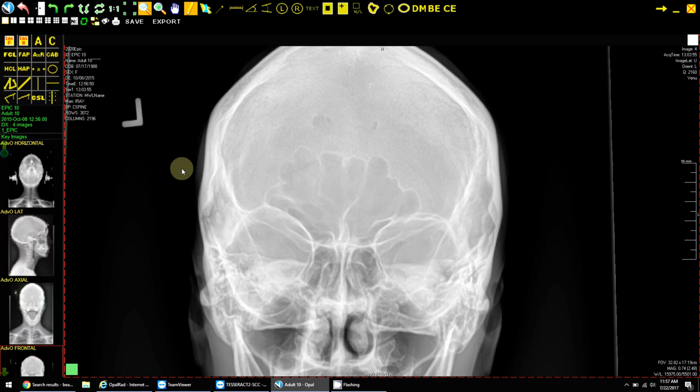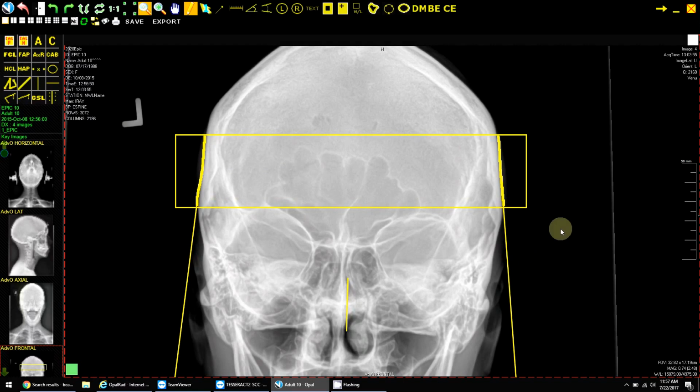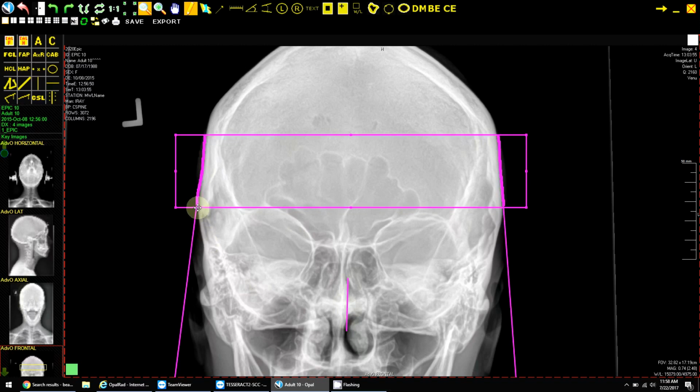So anyways, to dive into the mathematical reasons of how your tool works, it's actually quite simple. I thought it was due to a few different things, but it's even easier than what I originally thought. The first thing is it's not comparing pixel to pixel on both sides. I thought it would say, okay, what's the point here, and what's the point here, and then average it out and create this center line right in the middle. What it's actually doing is even easier than that.